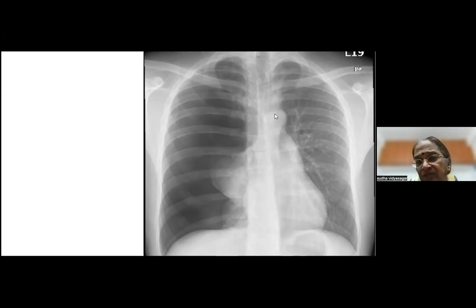Okay, there's a shift of the trachea, the shift of the mediastinum. Okay, the heart has come off the spine like that, and that is the edge of the collapsed lung. So this is a big one. And this is where you should look. There must be an edge. Before you call anything as a pneumothorax, please look for an edge of the collapsed lung.